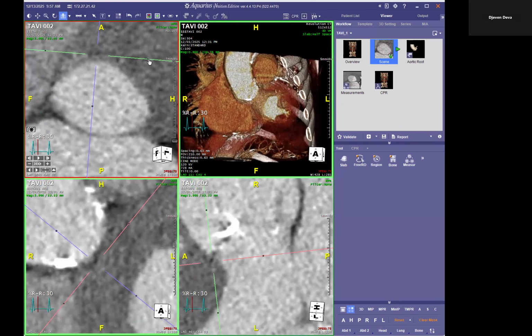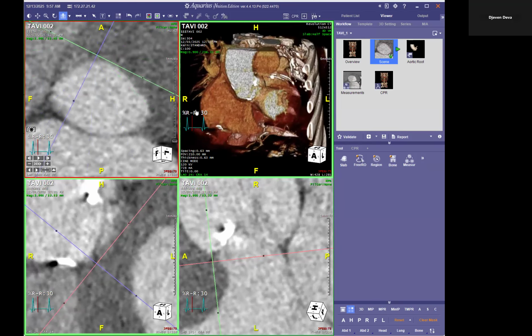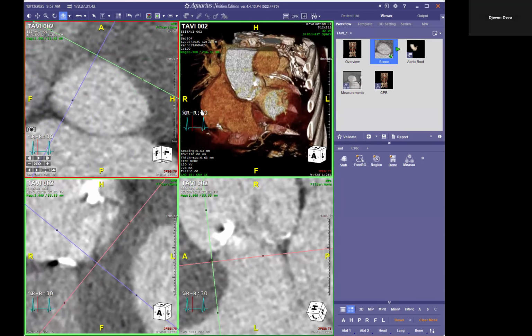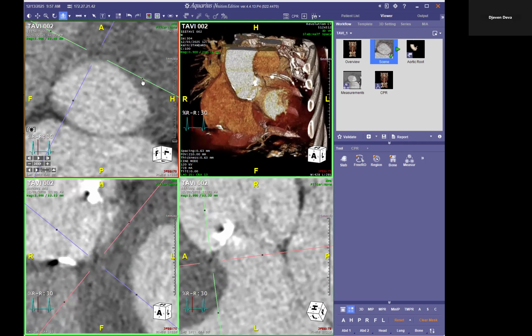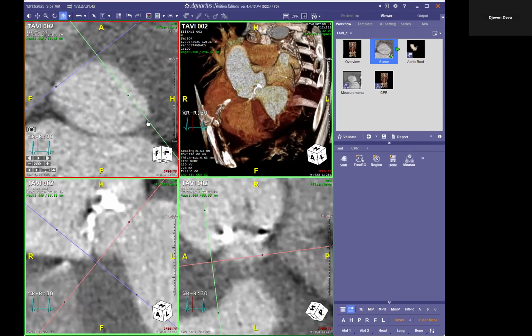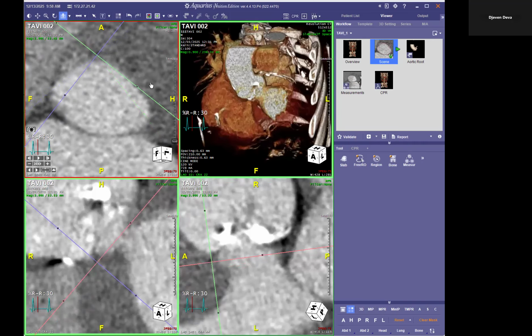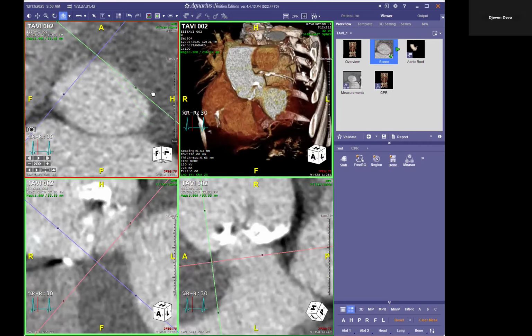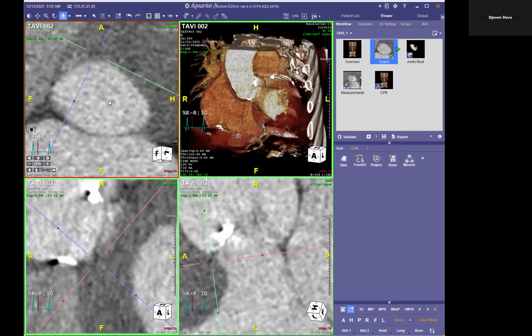Now I'm going to unzoom a little bit just so I have a better understanding of the surroundings. Yeah, and then this is the non-coronary cusp nadir. Pushing this pink line just underneath the cusp tissue of the nadir of the left cusp. Rechecking on my non, I'm happy.